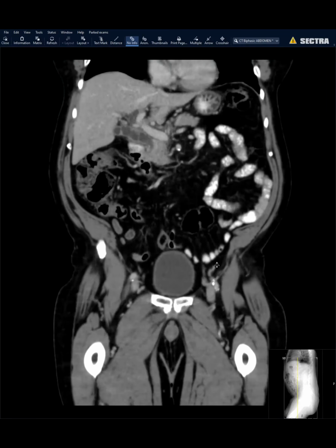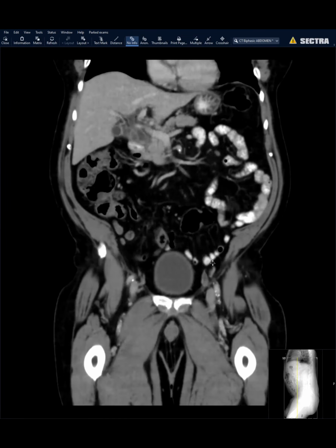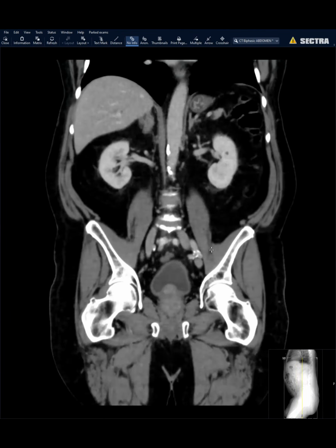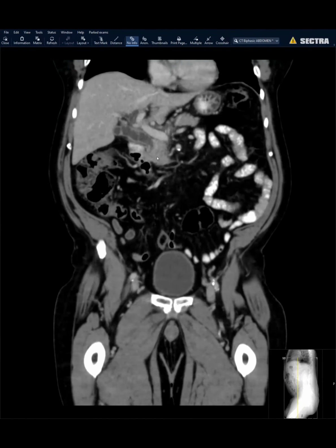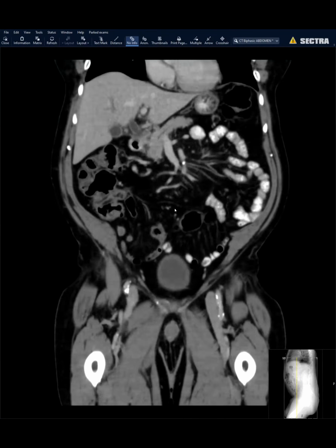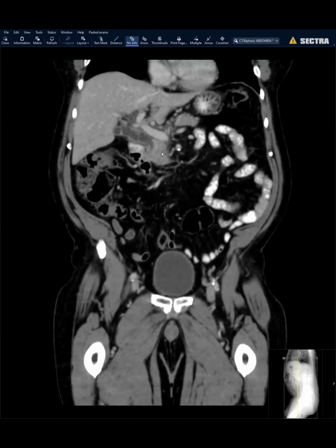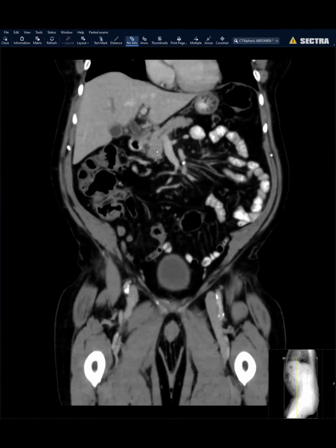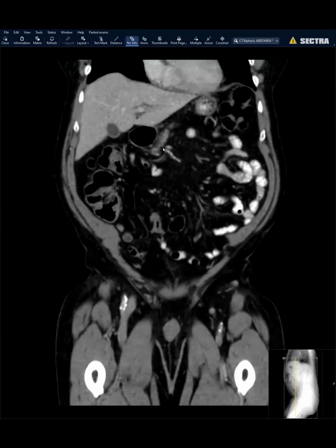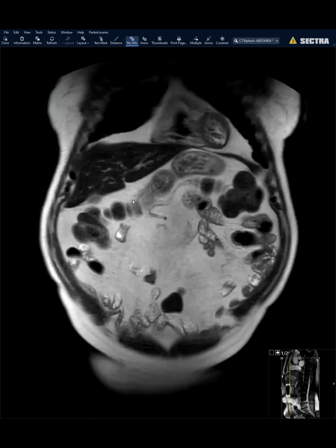So when I looked at it, my resident had prelimed it as enhancement of the bile ducts, and they were thinking it's some kind of cholangitis. What really struck me was that, as you mentioned, Aarti, there's this transition over here. And I thought this looked more like a Mirizzi syndrome to me. Of course, we don't see any stone here. But I asked my resident, did you look at some old scans? And they did not. And we went back, this from 2018.